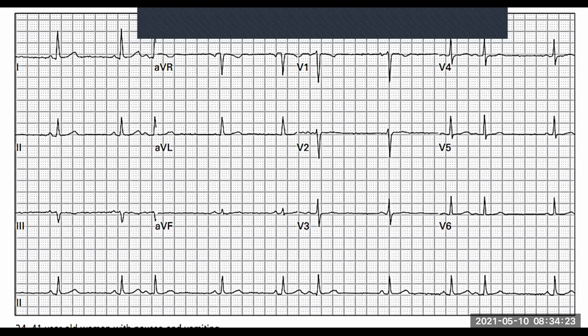Then we come to 1, 2, again, just over 3. And then we come again 1, 2. So it's a very irregular rhythm. All right. So here we've got 1, 2, 3, 4, 5. So it's not following any particular pattern. It's kind of just coming, going.